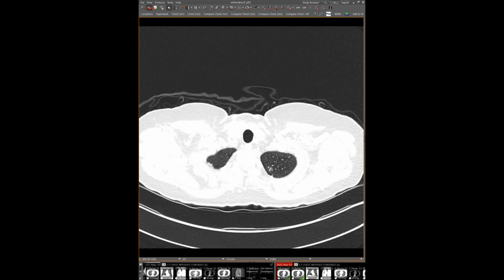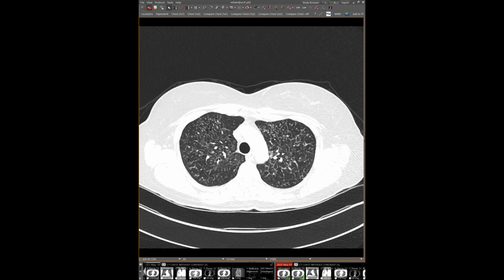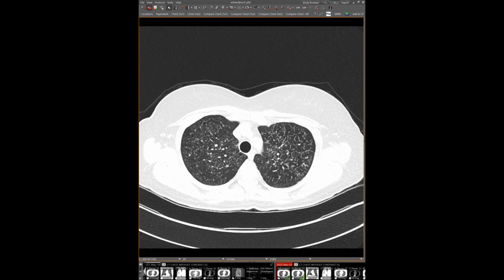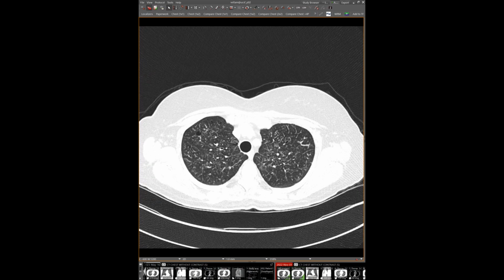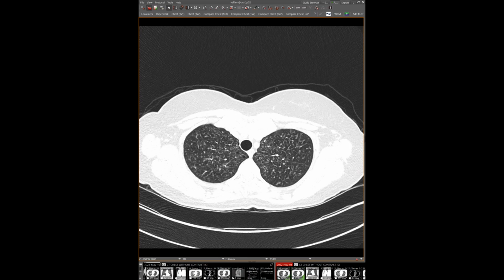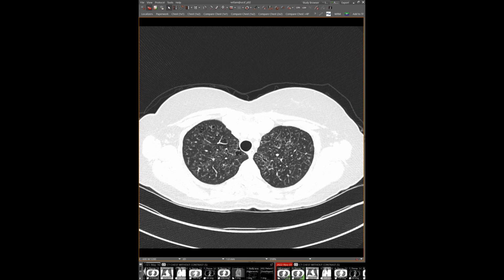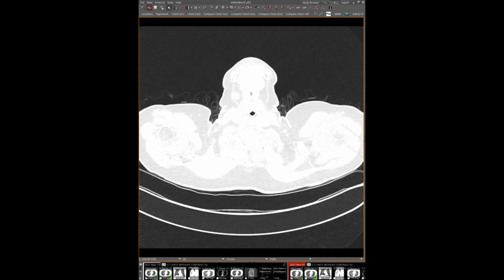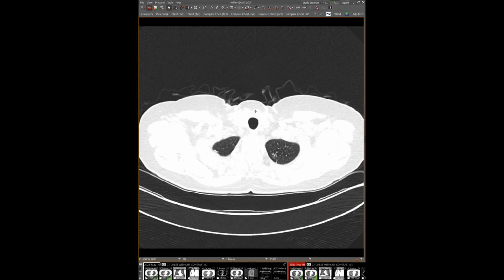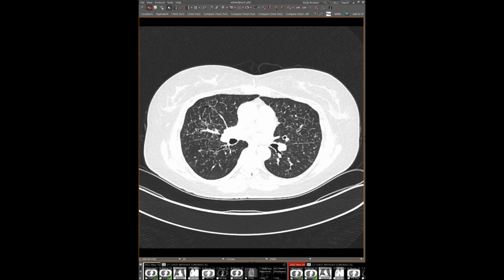The patient then, a couple months later, got an actual diagnostic chest CT, so we can see this in a little bit better detail. Again, this really marked thickening of the interlobular septae, some of which almost looks a little bit nodular, as well as all of these areas of what look like discrete ground glass nodules and some areas of cysts, some of which maybe have some associated little nodules with them. So this is 2022, and then I'm just going to speed ahead because realistically not a whole lot changes. This is now almost a year later. Same patient. This is what their CT looks like.